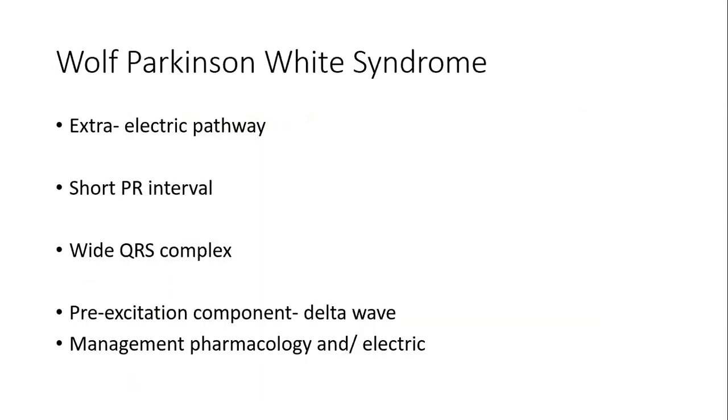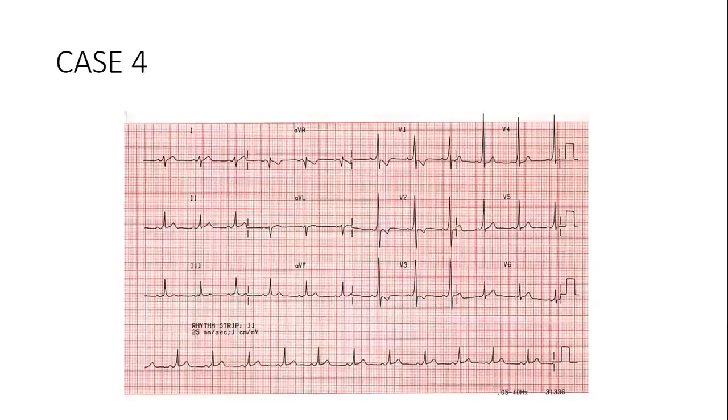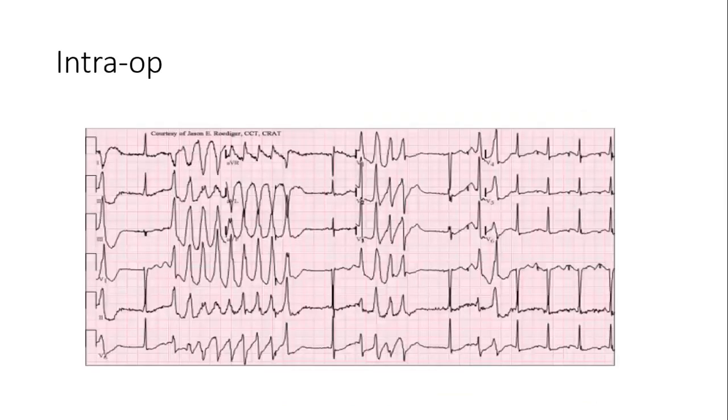Yeah, I asked on the previous ECG. With the torsades, if it's a spot diagnosis for this ECG, is it fine to say torsades, or can you just say it's a polymorphic ventricular tachycardia? Because isn't it torsades when you know the cause was hypomagnesia, or can you just say torsades as a spot diagnosis?